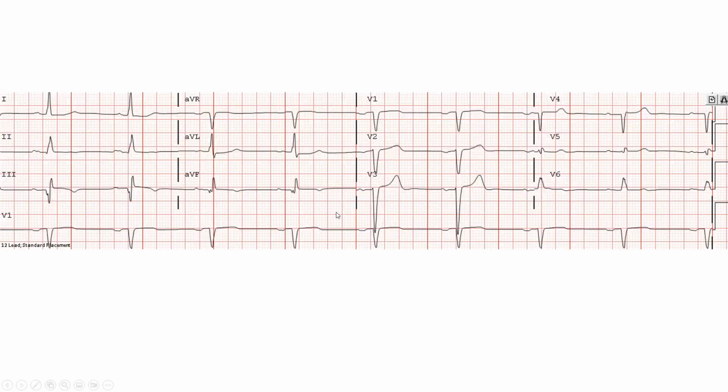This is another EKG. Can somebody read it for me? That QRS, let's say, is 115 milliseconds. LVH, QRS widening, and loss of Q waves in 1 and aVL. So this is incomplete left bundle branch block as part of the natural progression of LVH. What else? Don't forget, when we analyze QRS, we analyze height, width, axis, R progression in the precordial leads, but also Q waves. I always start by looking at Q waves.